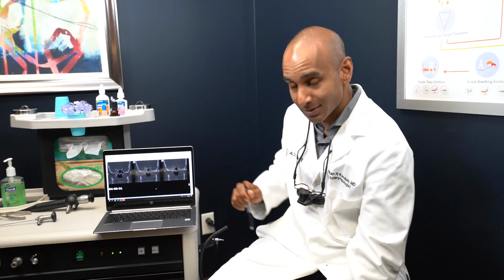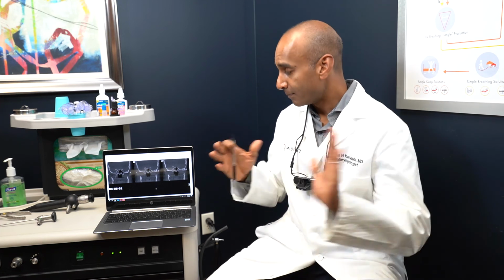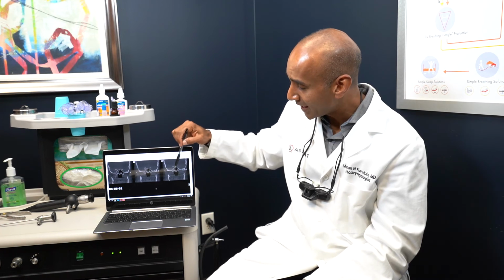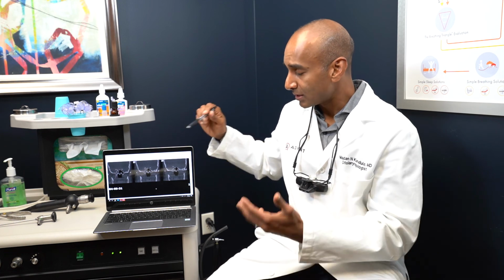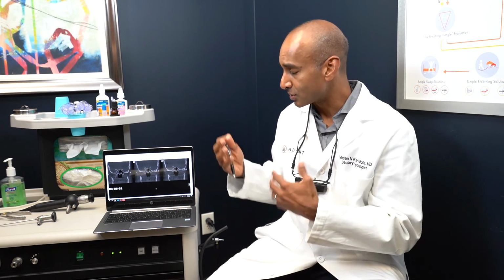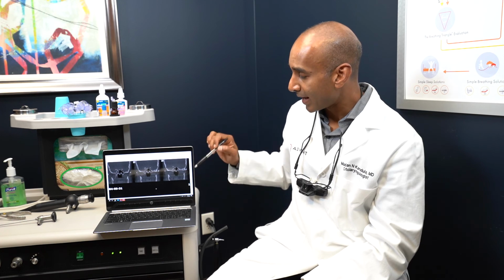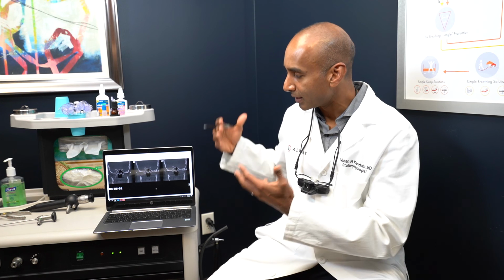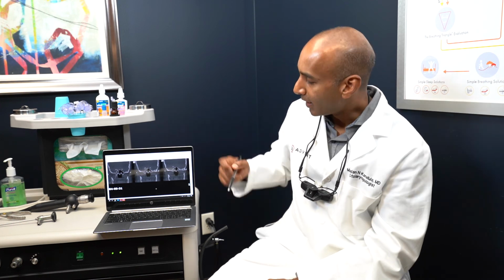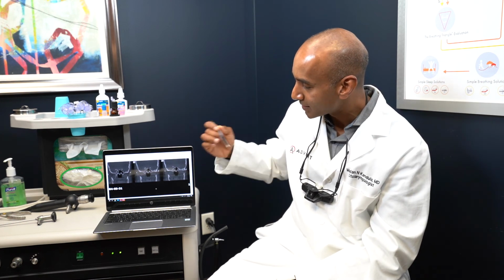And so that is a CT scan of the sinuses. It lets us see back to front, top to bottom, inside. You can't see any of these areas. We can't see into these sinus areas without imaging. So if we're trying to diagnose somebody with either tight sinuses or sinus inflammation, the only way to do that, if it's a chronic issue, is with that X-ray imaging. This is why it's crucial, and it lets us see everything that we need to see in order to develop a game plan and figure out what the right plan is for you moving forward. So X-ray imaging, CT or CAT scan imaging, that is what we're seeing, and that's why it's so important.